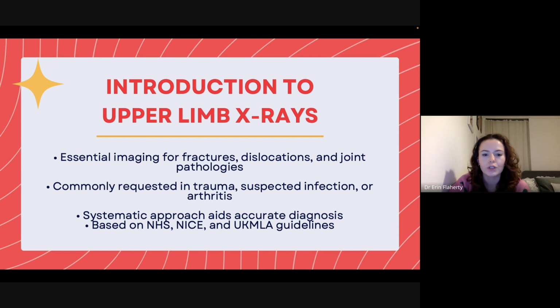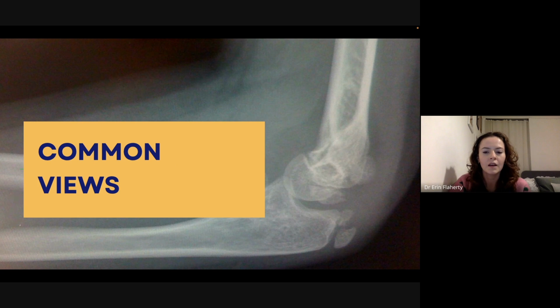Today we're going to be going through some systematic approaches of looking at X-rays and how we can get a good, accurate diagnosis and not miss anything, and look at some of the NHS, NICE, UK MLA guidelines for management for these. So common views, first of all.